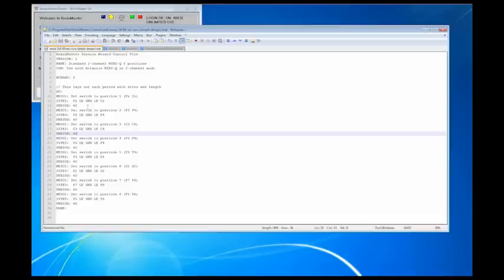So it's very important to know how long you're running because you're dictating it through the Session Wizard file. And what the Session Wizard also says here is which sites we're going to be using. So it's going to tell the training channels exactly which sites to go to. And also in this one, it's going to pop a message every time it jumps.